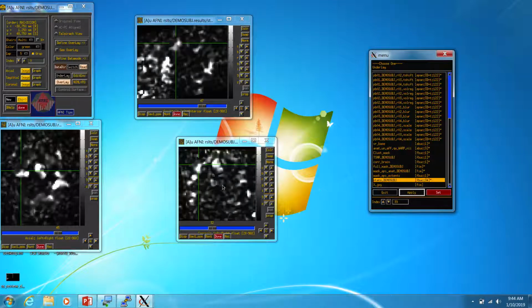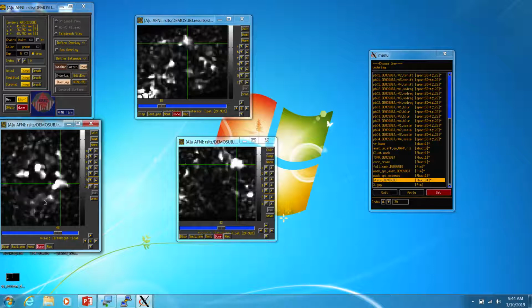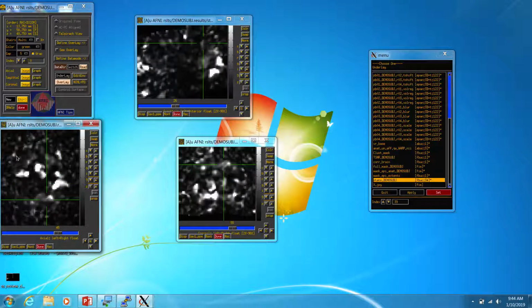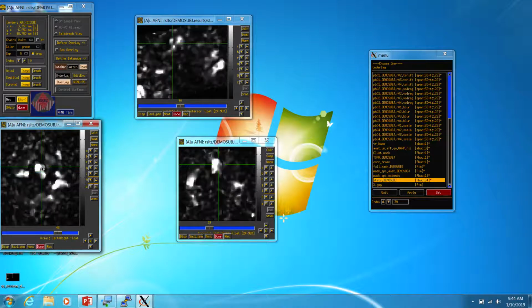What we end up with here is an image where you have hotspots that occur throughout the brain, and you can see a little bit of ghosting of the blur. This is a little hard to place in context, but brighter things in our brain image are more active, and darker things are less active.